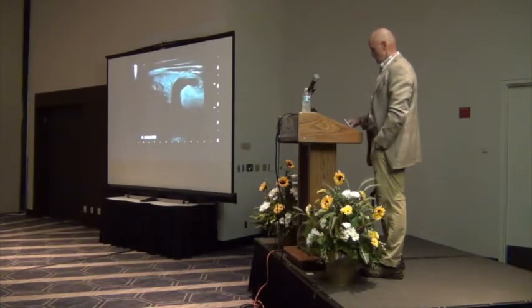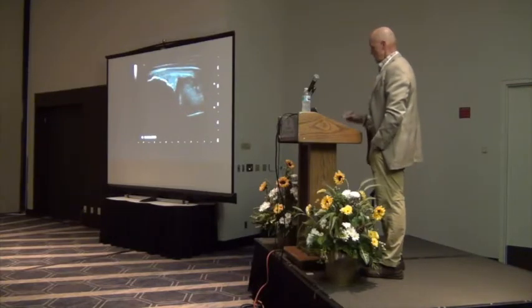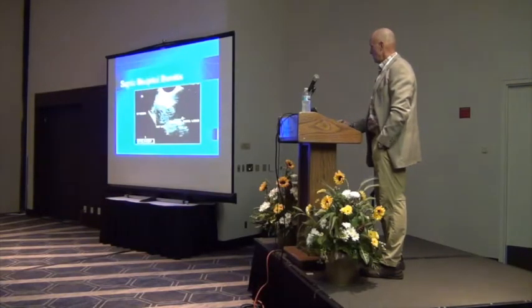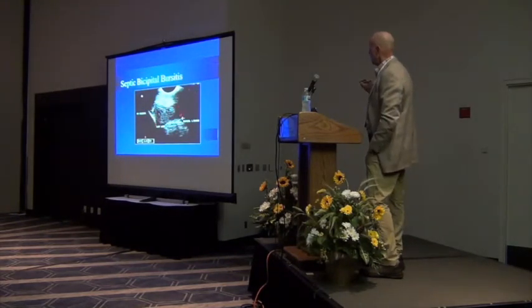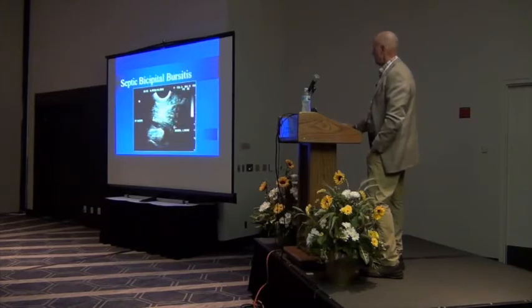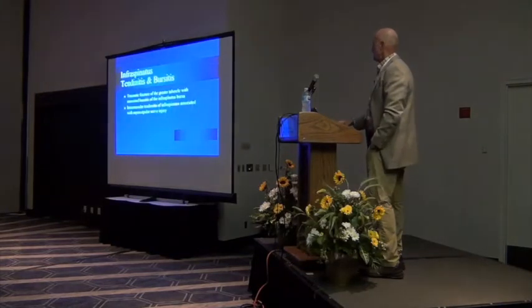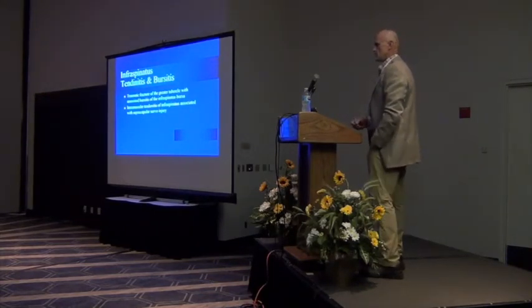This was one of those cases where when we did a recheck exam, this is already starting to show some change, and I'll have comparative radiographs. And these are just old film showing a lot of depth to get down to the lateral lobe, a lot of swelling associated with it. This is one of those 200,000 white cells in this sheath, a bursa that did fine. And that's the other thing, they seemingly do well with aggressive management.